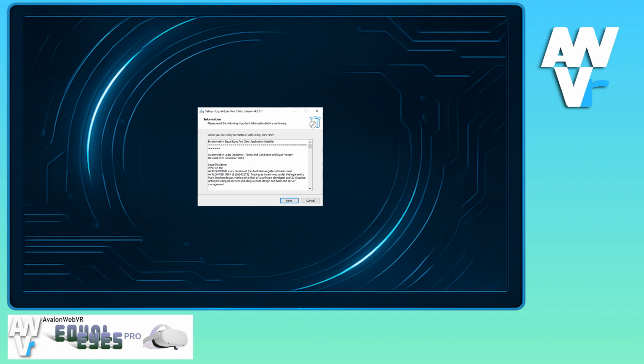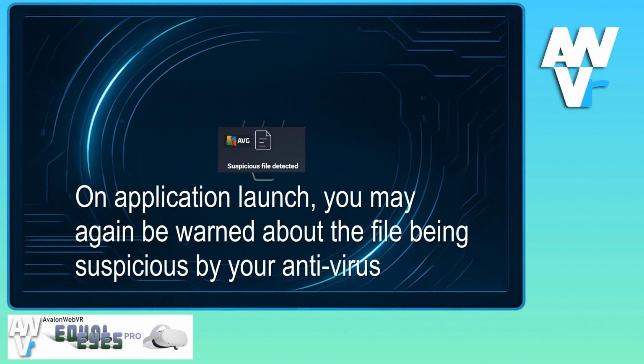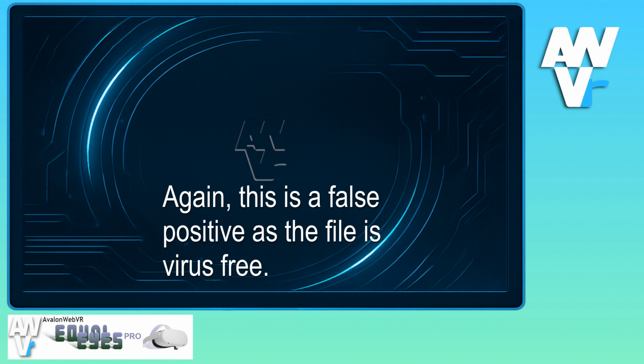Follow the prompts as presented. Most entries can be left as default unless you have any specific requirements to install. Start the application using the Start menu of your PC. Again, this is a false positive and can be ignored.